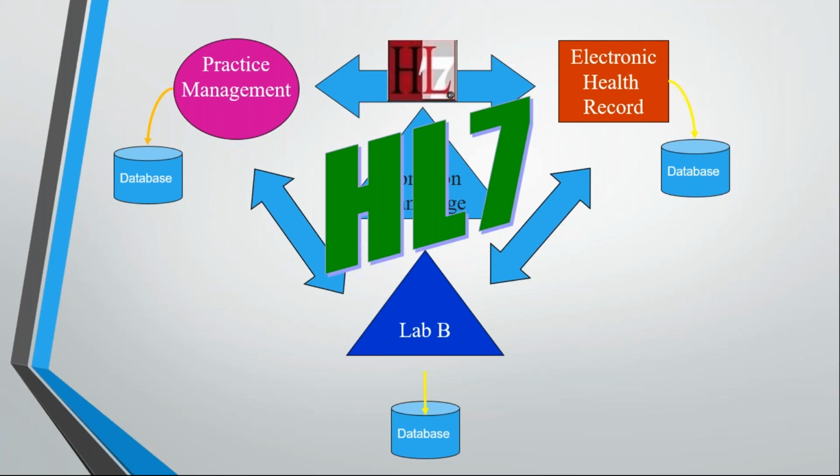In HL7, when practice management has to send data to the EHR system, the integration engineer on the practice management side will extract the data and convert it to HL7. Instead of inserting the data into the EHR database, he will just convert the data into an HL7 message and send it over. Now the integration engineer on the EHR side has to consume that HL7 message and insert the data into the database.